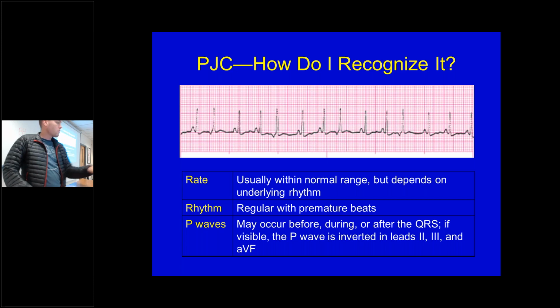Can you show us on the? Sorry. So here you got what looks like a fairly normal P wave morphology, right? And then you've got a quick beat with no discernible P wave. And then you've got another normal P wave, normal P wave.